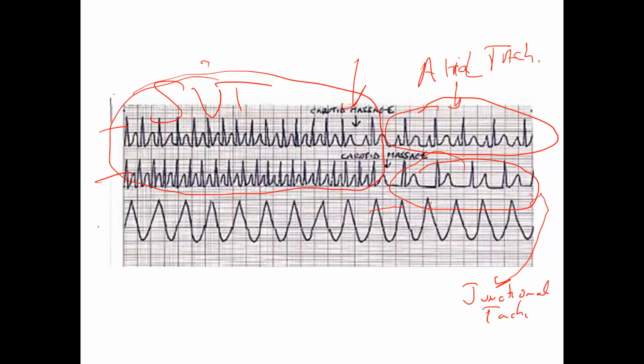Now, this one, you're not rubby-dubbing anybody's neck or anything. This is just ventricular fib, right? I'm sorry, ventricular tachycardia. Are we good? That's not supraventricular tachycardia because it's the ventricles. SVT means above the ventricles, meaning it could be sinus, it could be atrial, or it could be junctional. So the bottom one's clearly not supraventricular. It's a ventricular rhythm, and it's tachycardia. Whew.